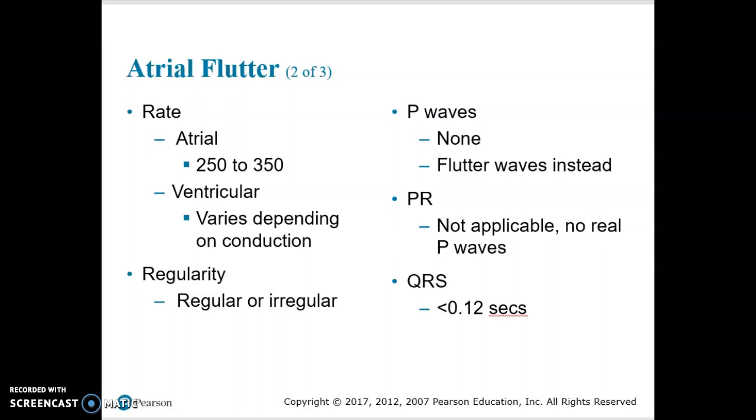With atrial flutter, we do not have P waves. There are no P waves. We have flutter waves. Flutter waves are present instead. Atrial flutter almost always can be seen in patients with heart disease.